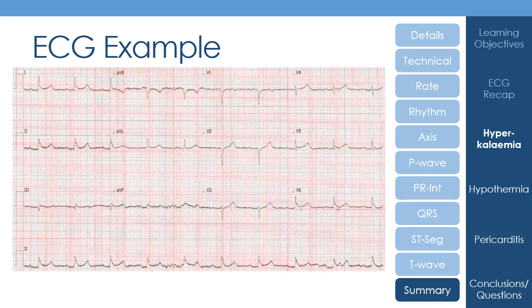Well, we've got a patient with a heart rate of 60 who's been found on the floor in the middle of the night. They've got quite significant interference on the ECG. They've got these J waves or Osborne waves, and they've got a prolonged PR interval and a borderline or slightly prolonged QTc as well.